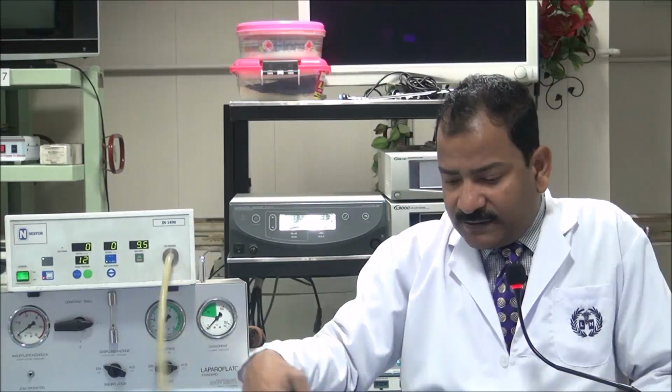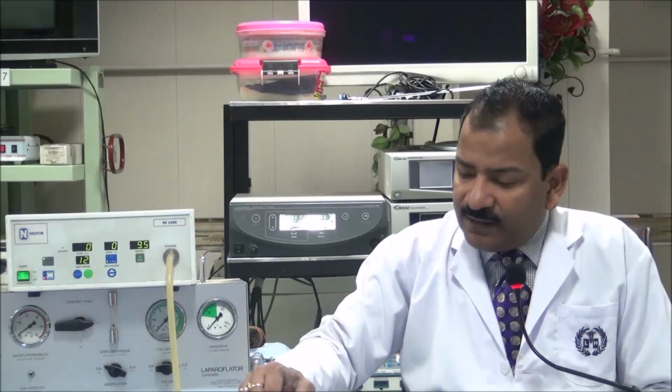So now I will ask you a few questions. If you answer those questions, that means you have understood the insufflator nicely. Question number one. Preset pressure is, the desired pressure, preset pressure is 12.